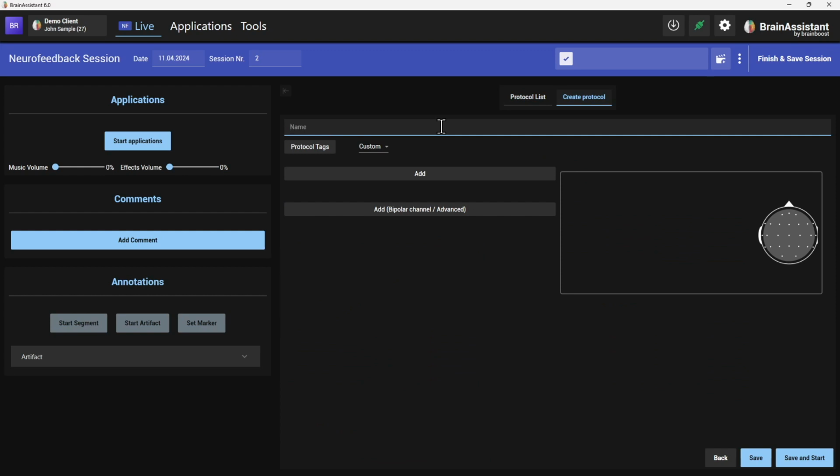You can watch the last webinar, or here, quite straightforward, you can just say, give it a name. So this would be Webinar April. Obviously, give it a creative name. You can give tags, control, flow, whatever you like. I'm doing random stuff now. I will come to the part bipolar channel.